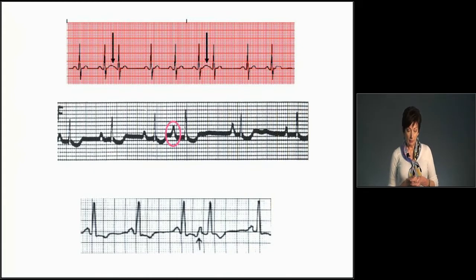And then the last strip, you see 3 QRSs and then another early beat with an abnormal P in front. So typically, if the patient is asymptomatic, we don't treat these. Always, whenever there is a sudden onset of arrhythmias, then something is happening. Maybe the electrolytes are out of balance. If the patient's on DIG, always suspect that DIG is the culprit.